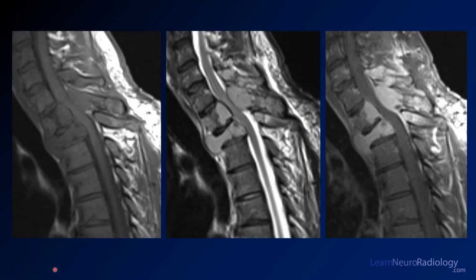So here you see the images that I showed you at first. So you've got a T1 hypointense abnormality that's replacing several of these lower cervical vertebral bodies. You see extension into the posterior elements here with loss of the cortex. So you see the cortex is gone here. And T2 simply confirms that this posterior cortex of this vertebral body is kind of bowing back.